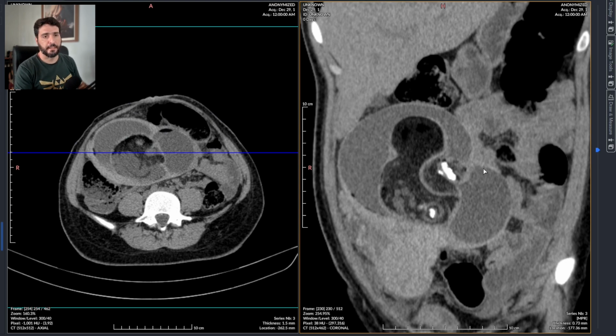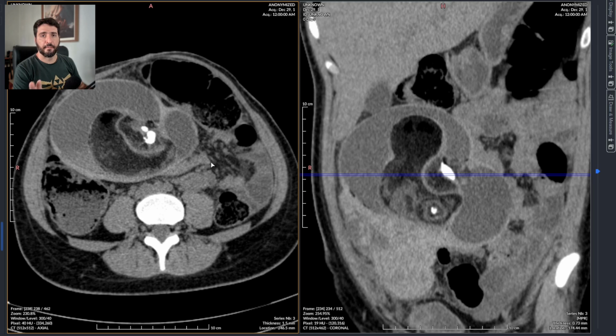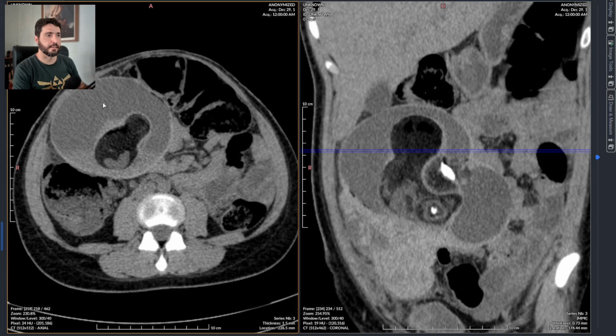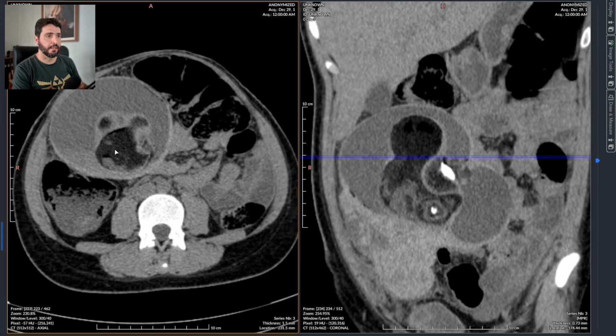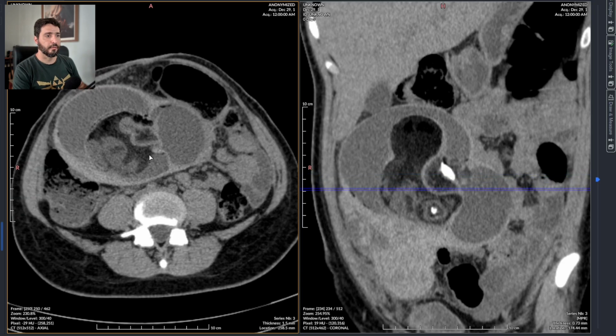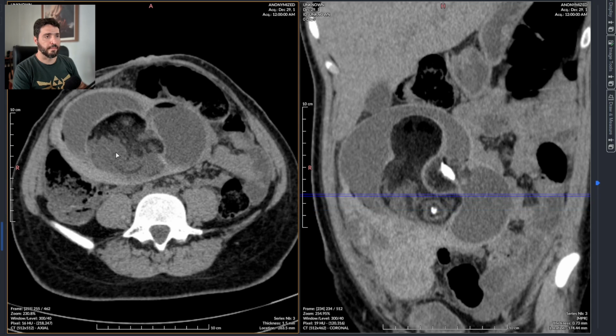We can readily see there are numerous densities. There are areas of different densities within this lesion. We can see this is a cystic attenuation, which means attenuation of fluid, 13.5 Hounsfield units. This is clearly adipose tissue, much similar to the subcutaneous fat and the intracavitary fat. So this is fat. We can also see that the walls are very thick.